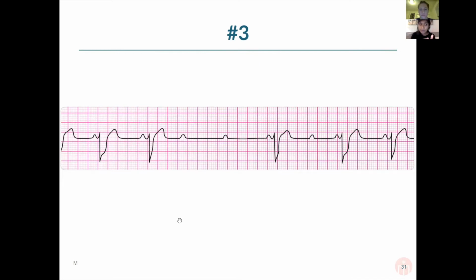So here, if you look at the second QRS complex, you see a P very, very soon before that QRS complex. So I'm like, okay, that one's pretty close. And then I look at the next one and I'm like, oh, there's nothing there. And then I see the next P, still nothing there. Then I see the third P. There's a QRS very close after that one as well. Then I see a P, then I see a long gap, and then I see another QRS complex.